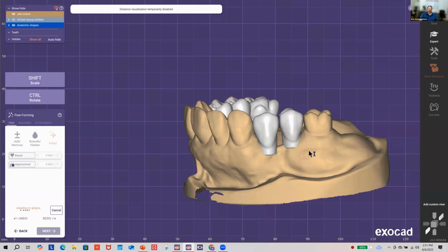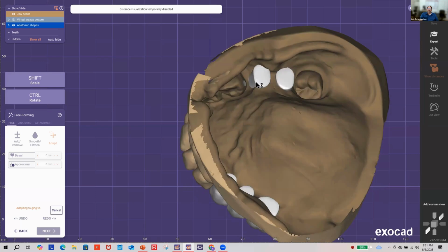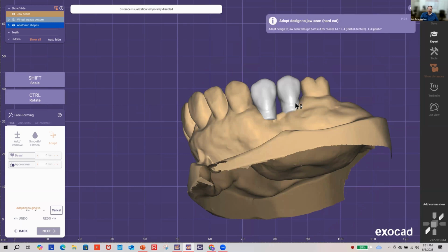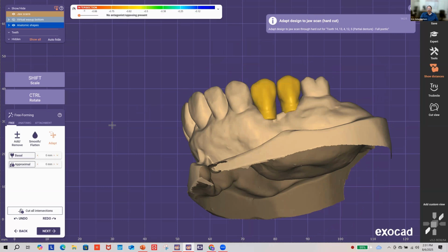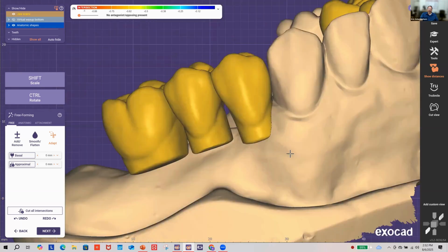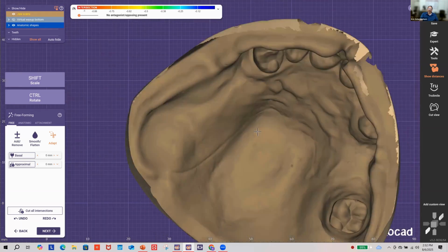So I'm going to hit OK. And what it's going to do is this area that's poking down through, it's just going to cut it back. Now, I used to tell people with older versions of the software to do this at about a millimeter, so that it would not only cut back, but it would make about a 0.5 millimeter daylight underneath the teeth. The reason that I don't do that anymore is because in the newer editions, it will adapt the contact here and the bottom. So if I have a 0.5 millimeter, it'll cut away a 0.5 millimeter off of these sides. And so I found if you just do it at 0 to get you in the neighborhood, then you finish the rest manually.